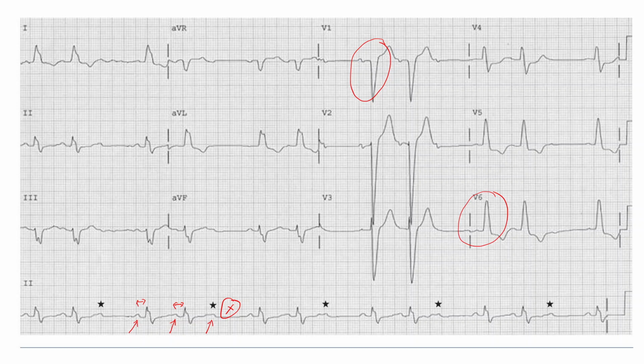One very important concept I must tell you: whenever you are getting a wide QRS complex, always try to find out what kind of bundle branch block it mimics. So if you see here, there is a predominant negative wave in V1 and a predominant positive wave in V6. That means it is following a pattern of left bundle branch block. Remember, whenever you are not sure about the bundle branch block, you have to say like morphology. So this is the LBBB like morphology.